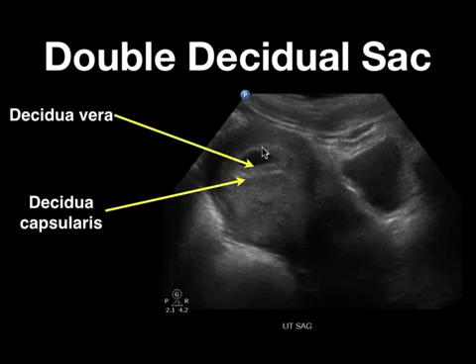Remember, if you don't see a yolk sac or embryo and you just see a sac-like structure, you can't definitively call it an IUP. So clinicians and researchers looked for ways to better understand the appearance of the intradecidual sac and to see if you could definitively call it an IUP before the presence of a yolk sac. And Nyberg felt that this was a highly sensitive finding, that if you saw a double decidual layer around that sac, that went along with an early IUP.